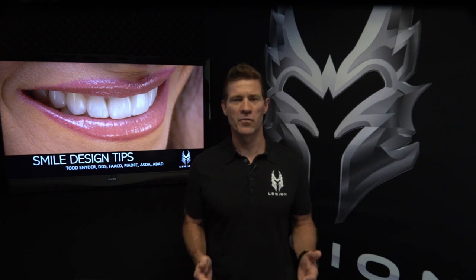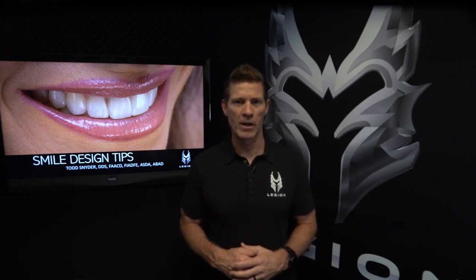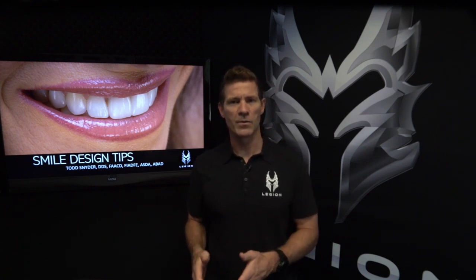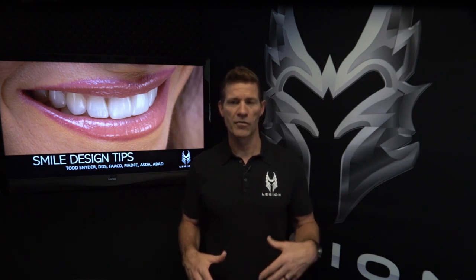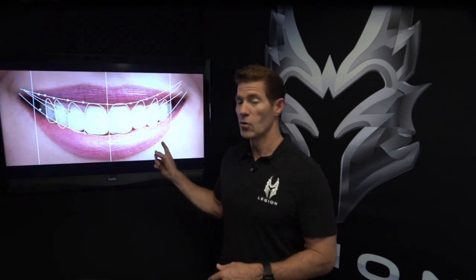Now, this is episode 4, where we're going to be discussing smile design principles using 1:2 magnification non-retracted smile photographs, a lot like this one here. Now, I use these to evaluate position of the teeth within the smile. Now, I'm looking at multiple points for harmony in the smile from left to right, which are noted by the curved lines and dots across the whole smile in this photograph.